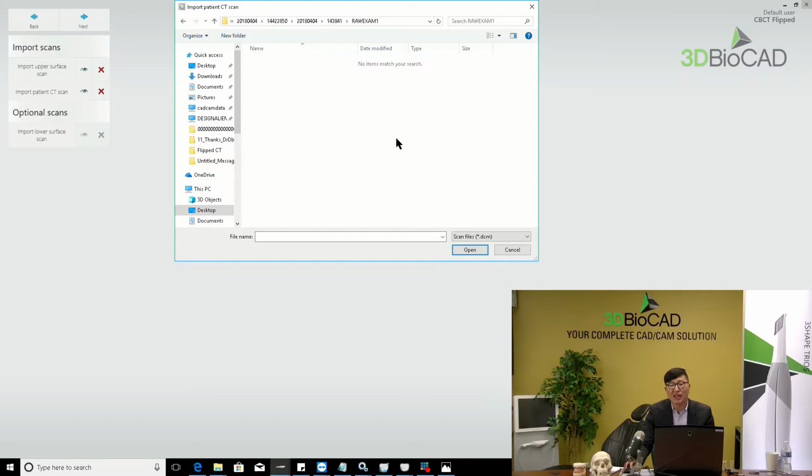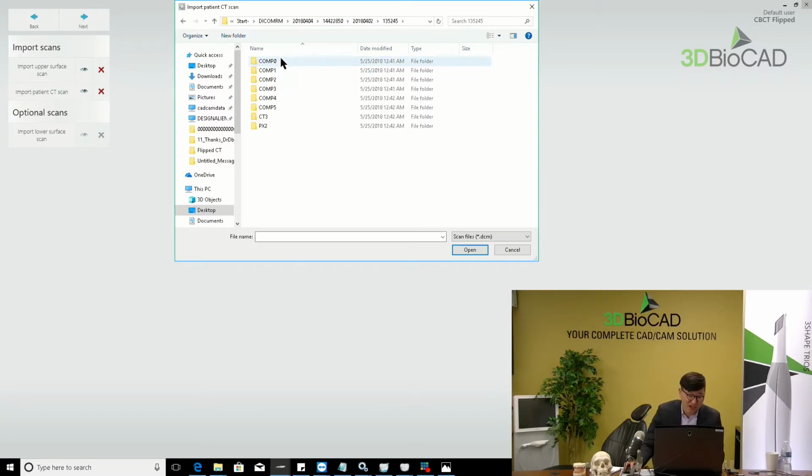At the end, nothing here. So I need to go back, and the top one. Okay, here, another folder again. Wow, a lot of folders here again. So no matter what, we have to have the CBCT, right?